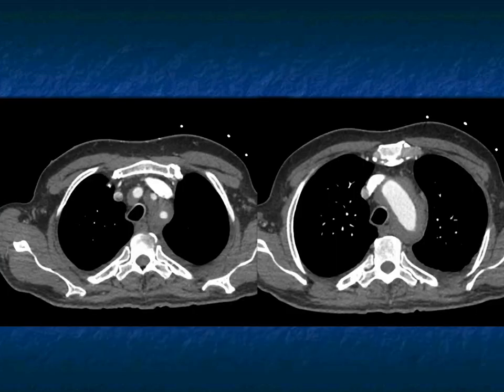This patient had back pain, and you see the soft tissue around the aorta. So the first thing you think about is there's a bleed present, and maybe it's intramural hematoma. For the image on your right, that's not bad. But intramural hematomas typically don't encase the branch vessels off the arch. And look at the left carotid, the left subclavian, even the right innominate.